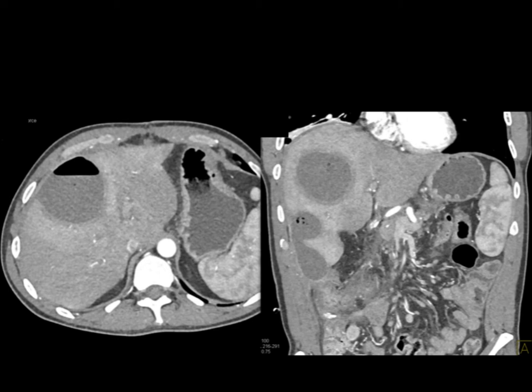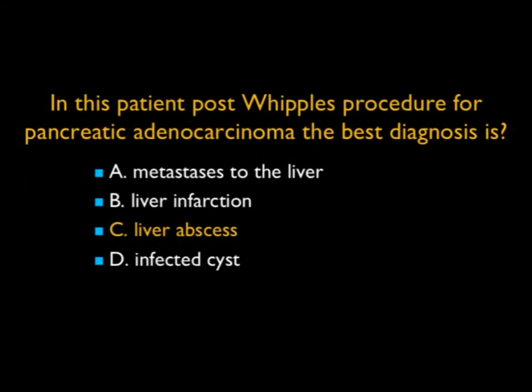Sometimes abscesses don't have air fluid levels, less than 20% in fact do, and particularly smaller abscesses can easily be confused with hypovascular metastasis. This case nicely also shows you the perfusion changes, the fluid level, the air fluid level, as well as additional fluid extending down near the inferior aspect of the liver. Just a very nice example.